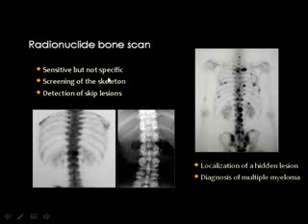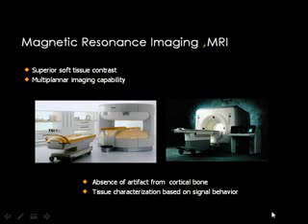The bone scan, as you all know, is sensitive but not specific. It says this is a pathologic area, but it cannot say accurately what this is unless you have the clinical findings and other imaging data. In this patient with mid or dorsolumbar back pain, you can see this sclerotic deformity, and the bone scan pointed to the presence of increased uptake in the pedicle of the 12th vertebral body, which was proved to be an osteoid osteoma, for example, that was not clear in the plain X-ray.